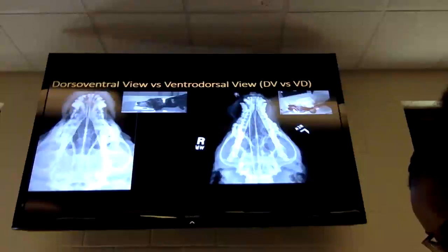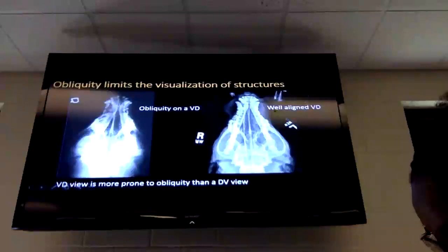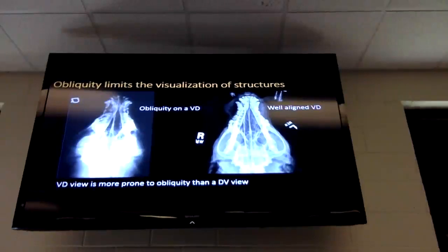Good. So is that correct, the waterline and then the image? Yes, okay, that's how it should be. So this structure is the endotracheal tube as well, which is in the way. So when we take skull radiographs, you make sure that the tube is actually not in place if possible. That also adds to the obliquity a little bit more. Okay.